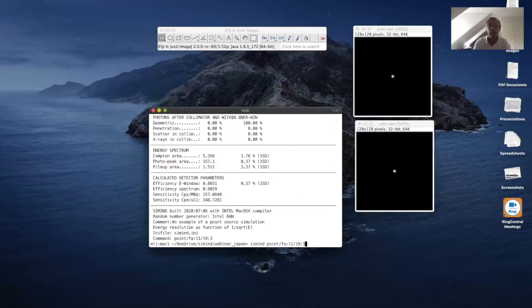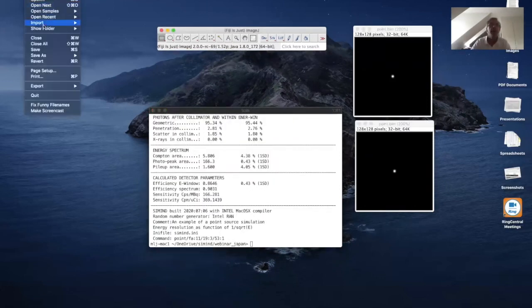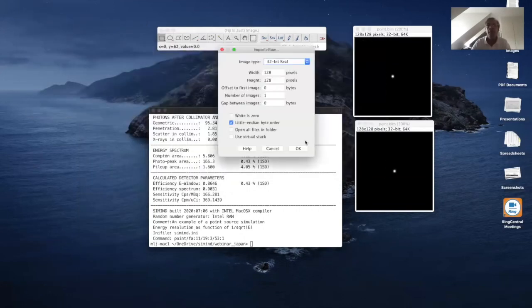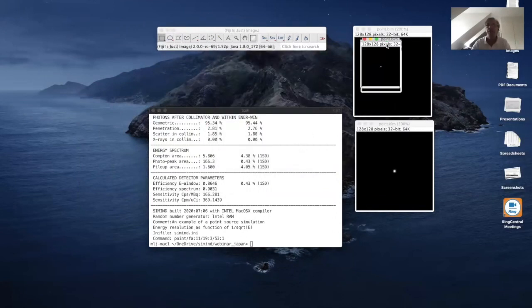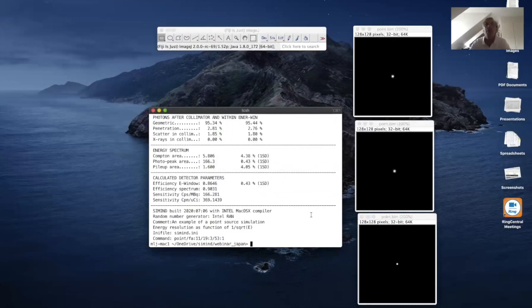So we now use collimator index 53 equal to 1. So we run that. It takes a little longer to run this because there are more steps going through tracing the photons in the lead. File again, raw, point, and we see no difference at all compared to the other. So why is that? Well, that is because we are simulating with technetium, and that has very little penetration.